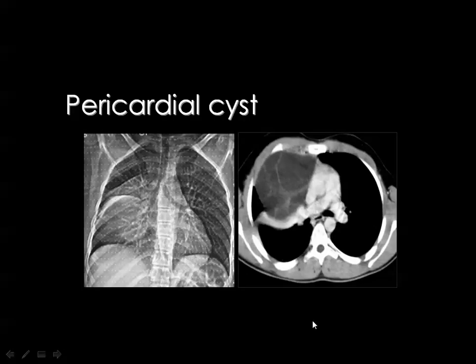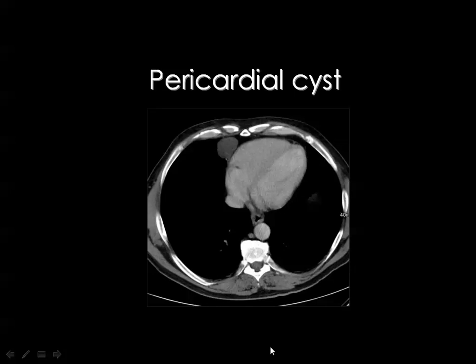And this is a good example of a pleuropericardial cyst. And being a mediastinal lesion, you can see compression of the adjacent lung. Then this lesion is seen here in the scanogram of the CT of the chest, and the CT scan shows the cystic lesion with internal septation along the right cardiophrenic angle with compression of the adjacent lung. And this is the small pleuropericardial cyst present in a characteristic location, as you can see here.